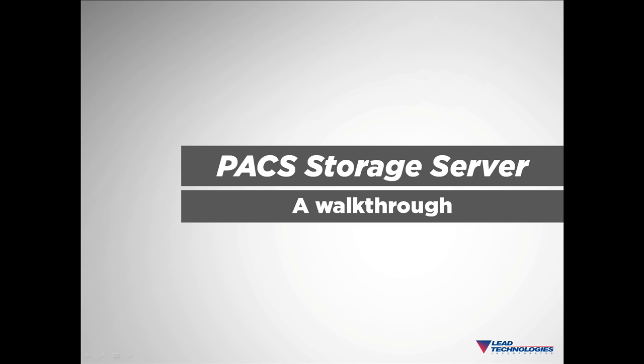In this video, we are going to discuss the features of our LEADTOOLS PACS DICOM Storage Server demo and show you how you might use it in a PACS solution. The demo is meant to be used as the groundwork for a storage server for use in real-world enterprise systems. But before we can cover the server, let's take a brief look at how the LEADTOOLS medical framework is structured.